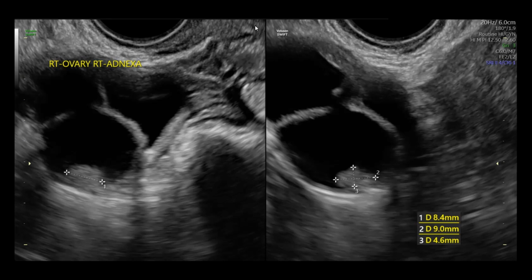And hopefully through this Get Reporting with me, Dr. Matthew Leonardi, you're also going to get better day by day and help our gynecologic patients understand what's going on with their bodies, help their doctors understand what's going on in the body, so that way they can get the right diagnosis for the right treatment.